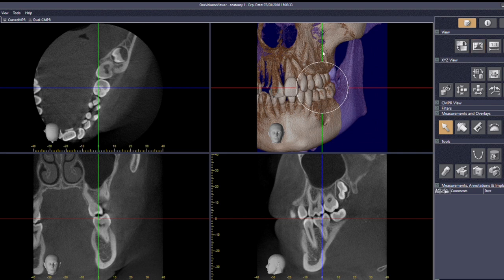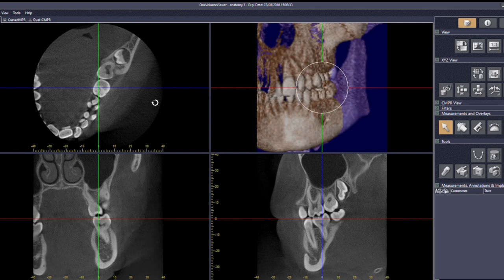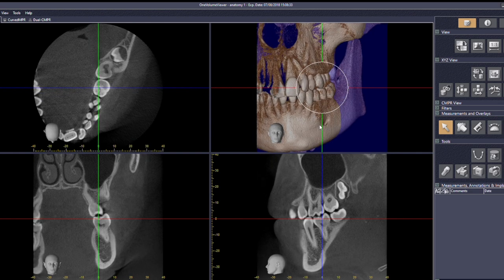This view has not come to yet. This is called a volume rendered view. Now at the moment it's coupled to these views. And I'll show you what I mean. When I spin these views round, it will spin too. That's fine. See how it goes a bit grainy and the software goes a bit laggy, and also it's quite tricky to see what's going on.